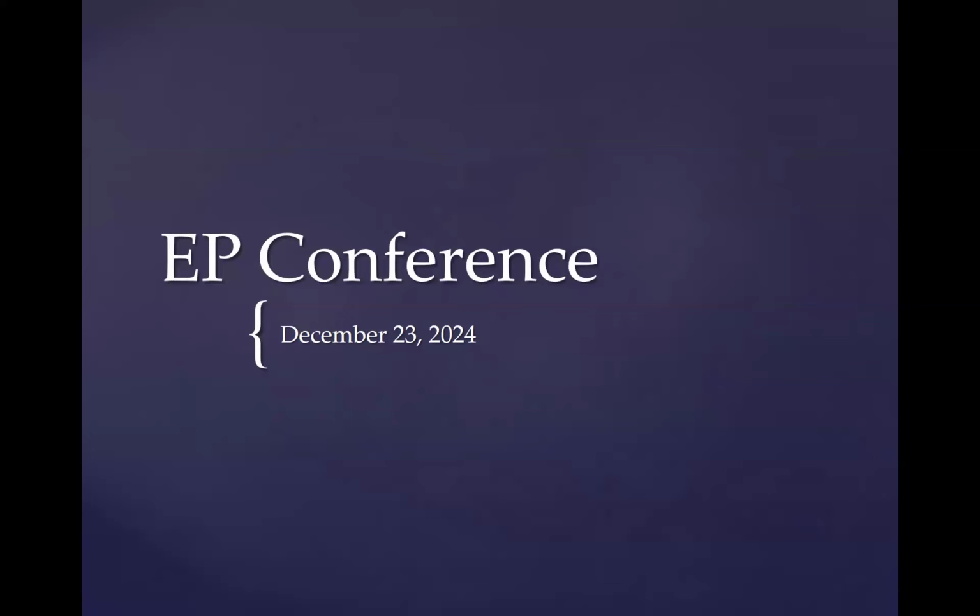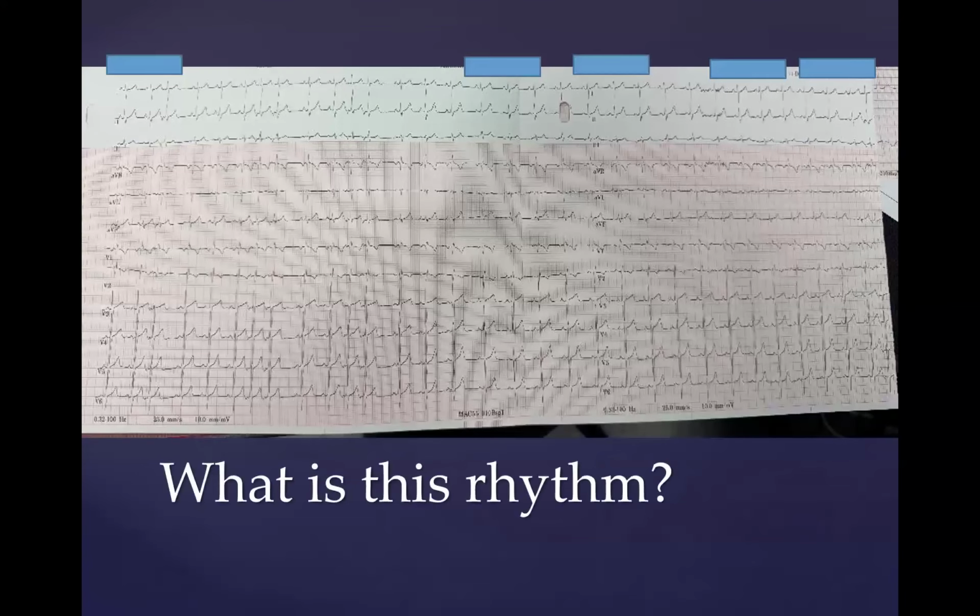All right. A brief one today. Final EP conference, I guess, of the year. Here we go. Okay. This is a tracing that one of the staff gave to me. Question is, what is this rhythm and how would you manage this? So why don't we ask Dr. Bezdakova what she thinks is going on here.